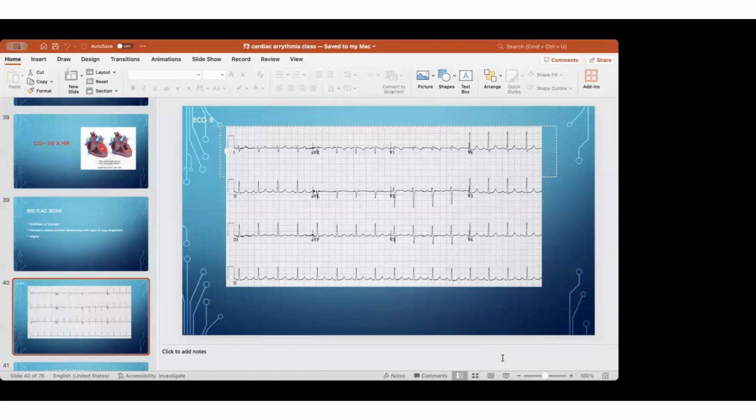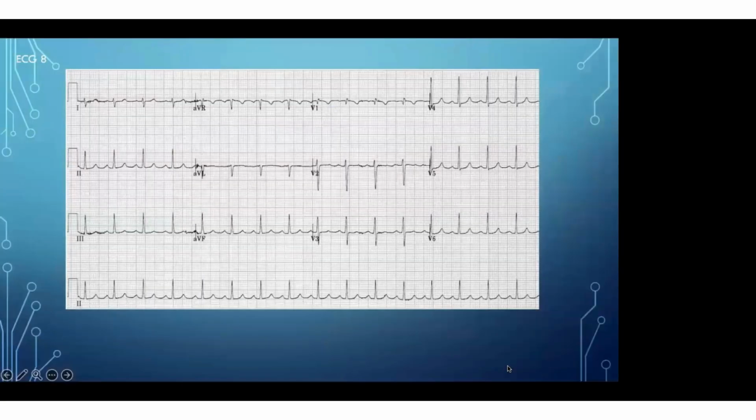First I will be telling about how to assess a tachycardia ECG. First the rate, the P wave relation to QRS, the intervals: PR interval, QRS duration, QT interval, and the ST-T changes. You have to assess a tachycardia ECG like that. Is it regular? Is it a wide complex or narrow QRS tachycardia? That's the first thing you do.